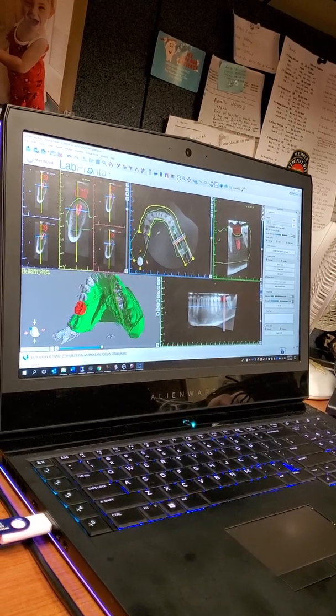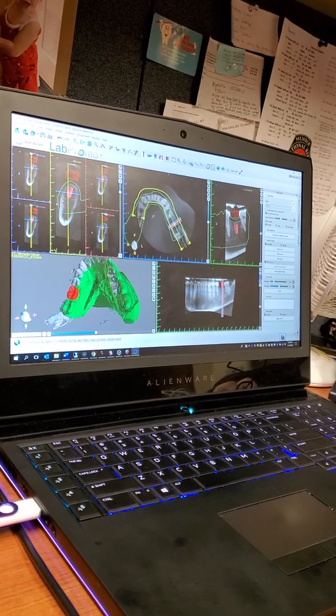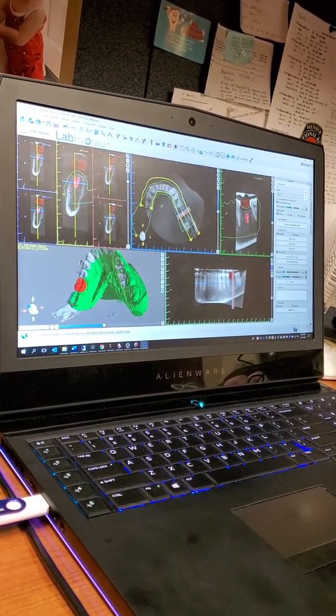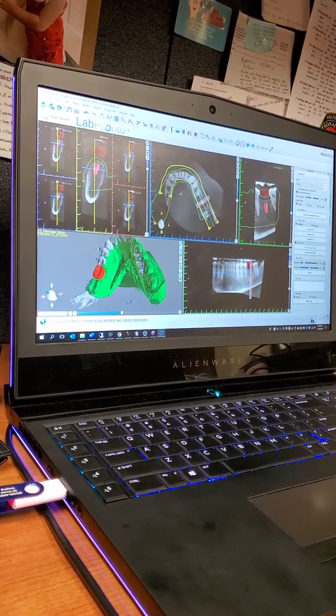So if you start off with advanced in the upper right, these panels automatically open, or you can set them to preset like I have mine. So every time the computer opens, it does that. So I want to draw a curve. That's how you fabricate the guide.